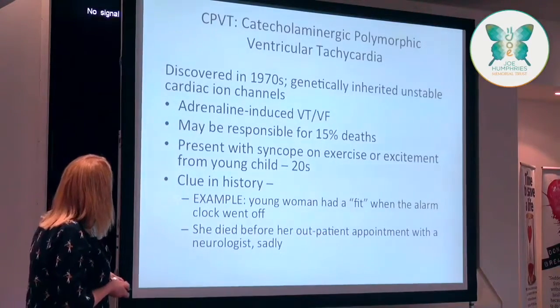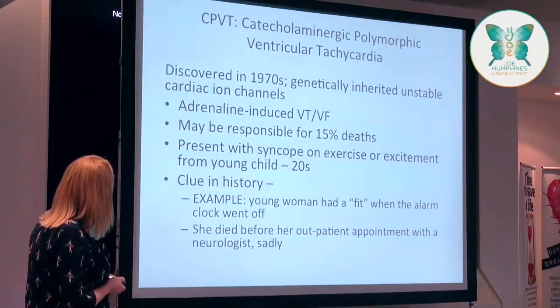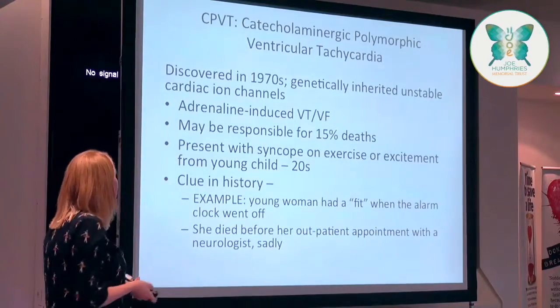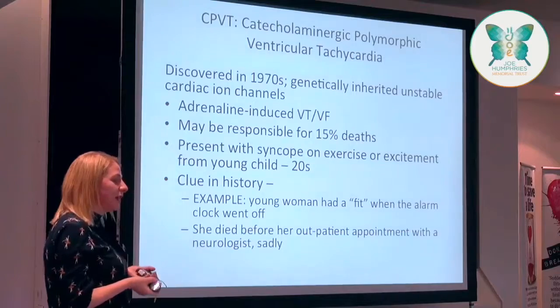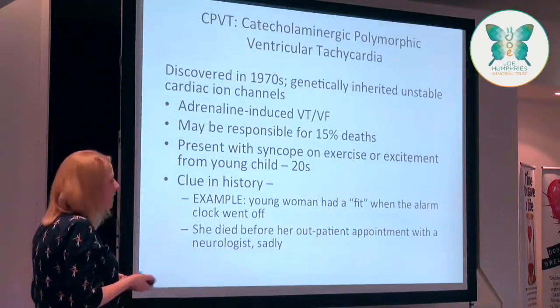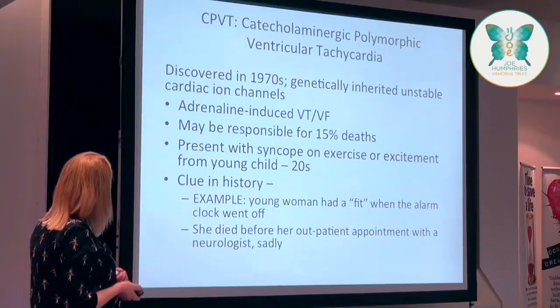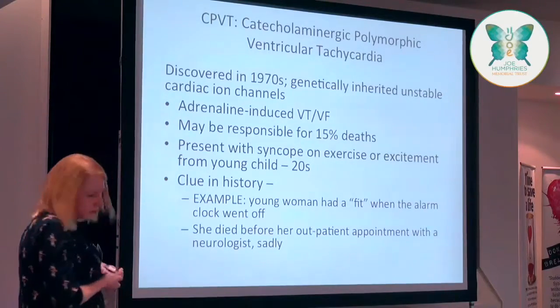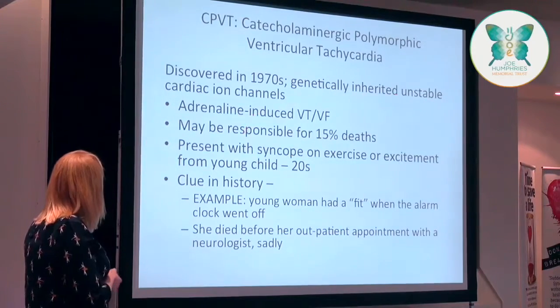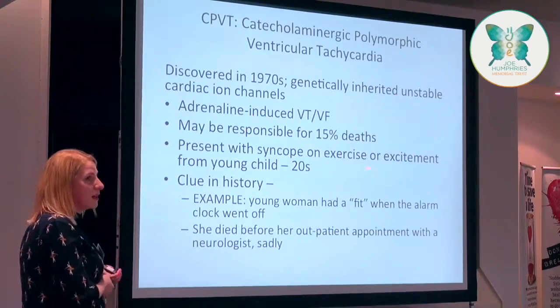Okay, this one is adrenaline-triggered. It's caused when someone produces a lot of adrenaline or gets very excited or frightened, and it causes them to go into VT or VF. So I know there are examples that Ffion's been telling me about, of patients presenting with collapsing when they get excited.